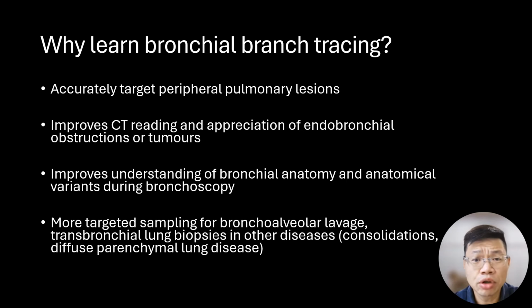Why should we learn bronchial branch tracing? Well, whilst automated methods such as virtual bronchoscopy, electromagnetic navigational bronchoscopy, and robot-assisted bronchoscopy exist, they are still unable to supplant the accuracy of mapping achieved through manual CT reading.